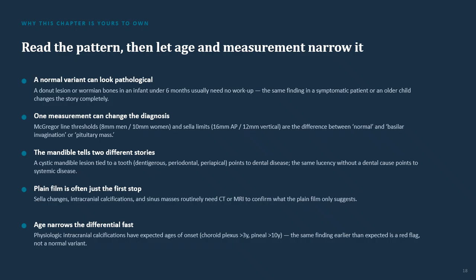All right, now we're wrapping up the skull patterns, and this is just our summary of what we discussed. With those skull findings, typically the radiologist or the doctor is not going to base it on the skull appearance alone. Some of the things they need to take into account when looking at a pattern: sometimes they may need to do measurements. They're also looking at the location of the appearance, and the patient's age can be telling as well.